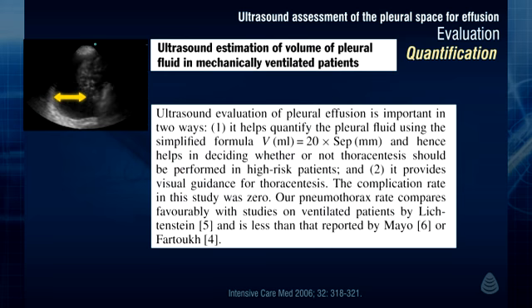Based on the Balik et al. method, the volume of pleural fluid is estimated using the formula 20 times the maximal separation distance between the two pleura, which is 70 mm in this case. The result is an estimated pleural effusion volume of 1.4 liters.